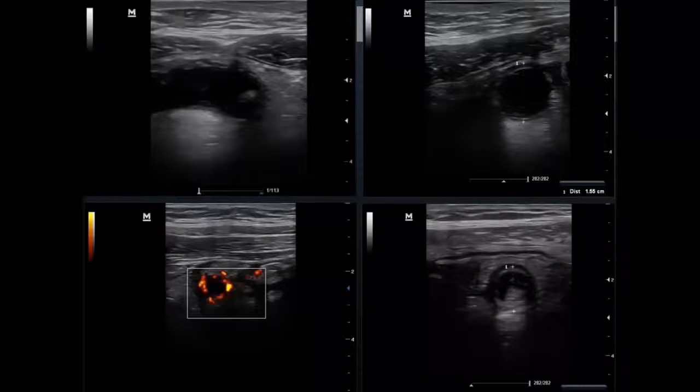So here in the top left, you've got a large fluid-filled blind-ended pouch in long axis, measures around 1.5 centimeters with an appendicolith in the very tip of it. Then that same structure in short axis now, measured here from outer wall to outer wall, 1.5 centimeters. Definitely acute appendicitis.